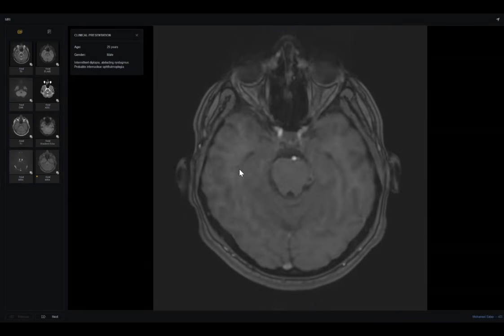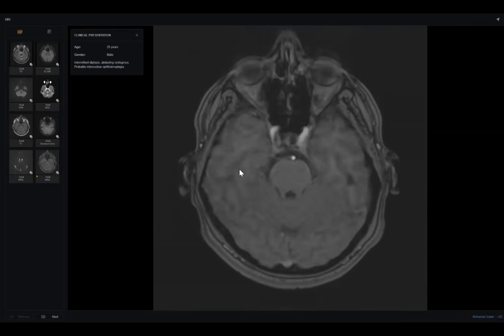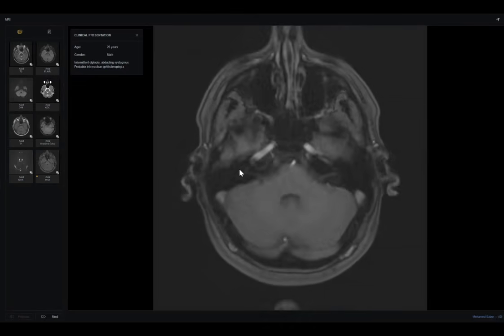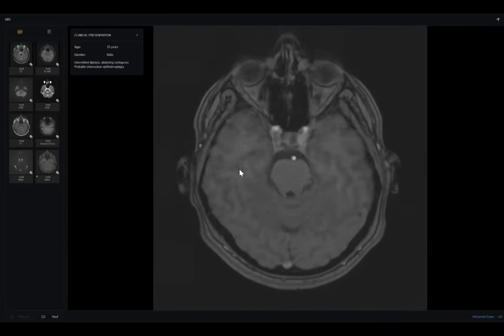Why does one candidate ask if it may be the posterior communicating artery? Is it this one? Why or why not? The posterior communicating usually arises superiorly at the level of the circle of Willis, and then it communicates to the posterior cerebral artery rather than the basilar. Excellent. Thank you, doctor, so much.